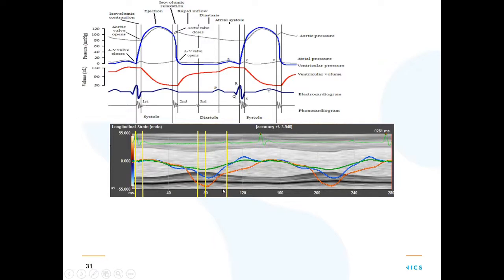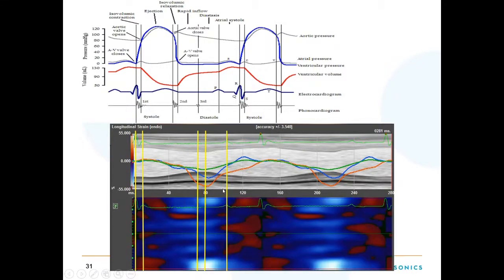And if you look at the strain parameters on the first page, and we extend those points into the heat map, now we can try to make sense of why the heat map looks the way it looks. So in longitudinal strain, you'll see that during isovolumic contraction, the entire heart is not necessarily all red and all blue like radial was.